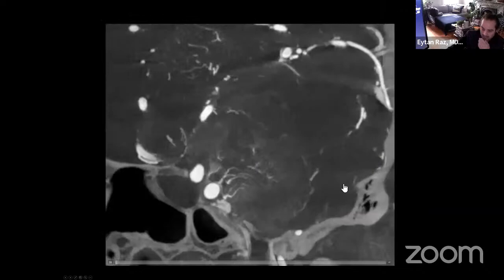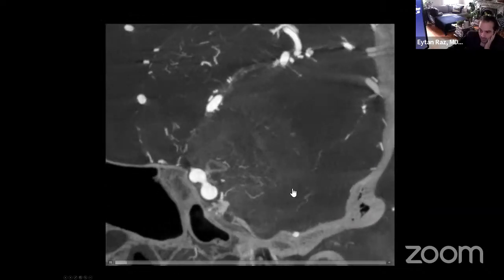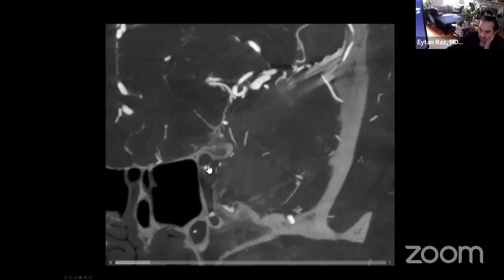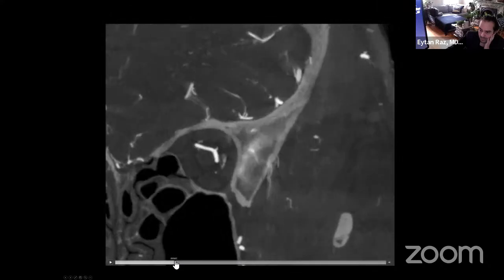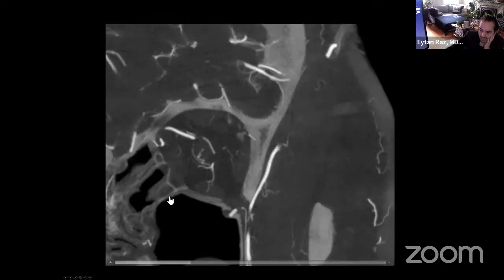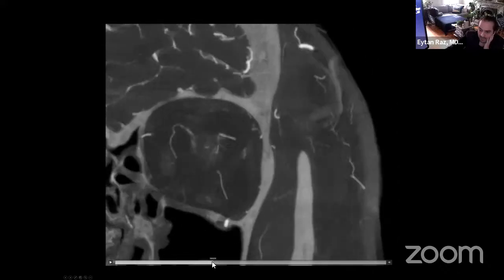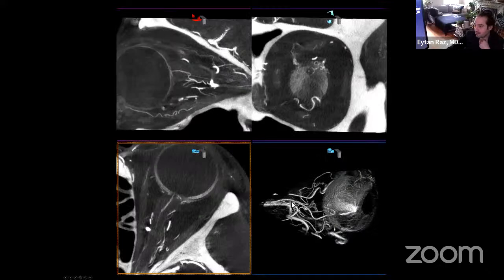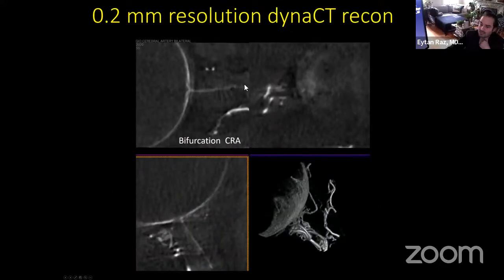And this is an example of the volume obtained in a patient with a tumor. This was a pre-tumor embolization. Now you follow the ophthalmic artery here. The ophthalmic artery goes back, and then there it is. On this coronal perspective, you see the central retinal artery perforating the nerve, going to the center of the nerve, and from there it is, the central retinal artery getting to the posterior globe. And these are just screenshots of that central retinal artery in two views. You can start playing around, doing 3D imaging, and understand the more distal part.